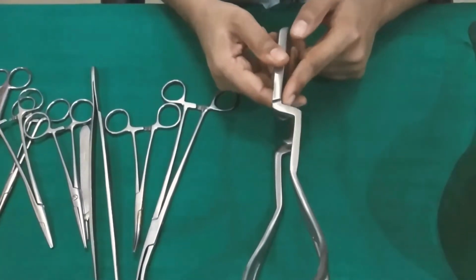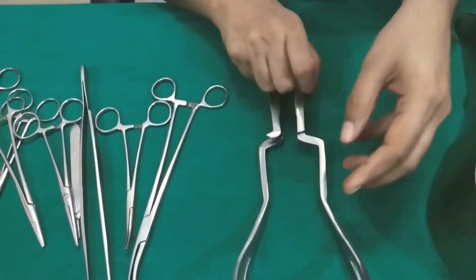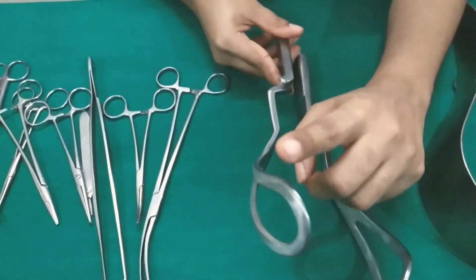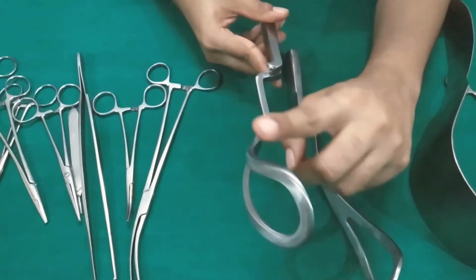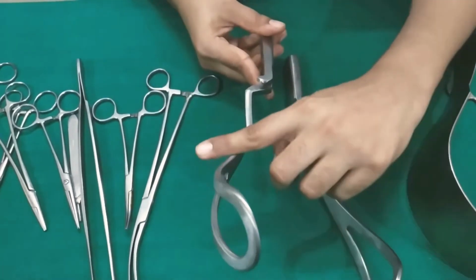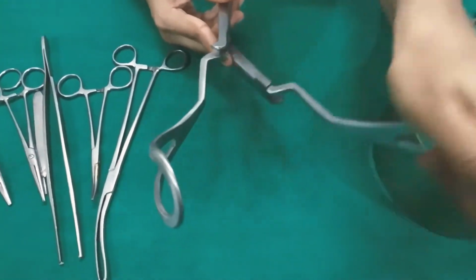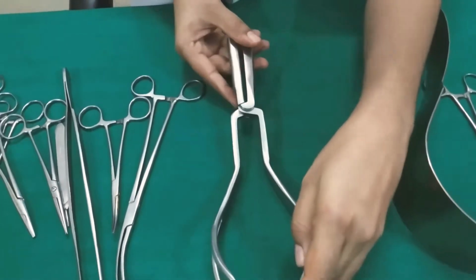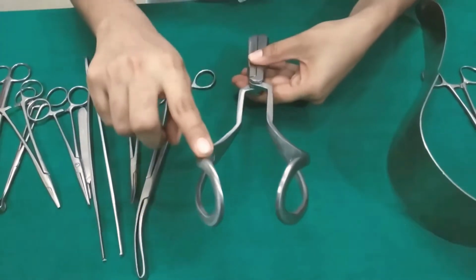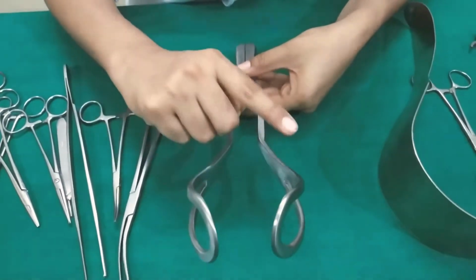So the question is how to identify the blade. When an isolated blade is present, first the tip should be pointed upward in this way, the cephalic curve is directed inward, and the pelvic curve forward. Here you can see this is the left blade. When articulated, I have to keep all three criteria in mind, same as above. The blade which corresponds to the left of the maternal pelvis is the left blade, and the one which corresponds to the right side is the right blade.